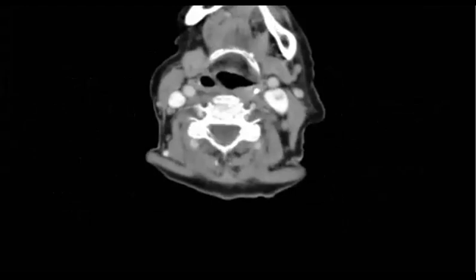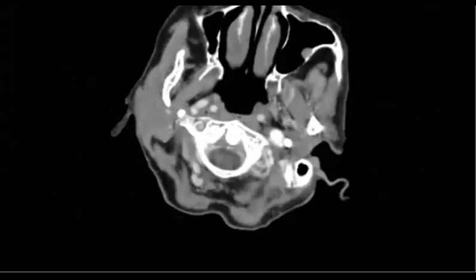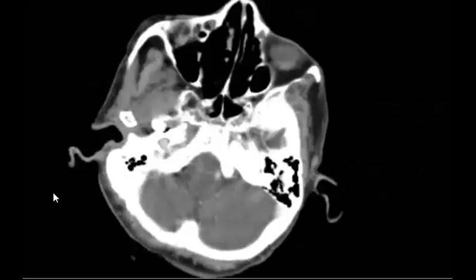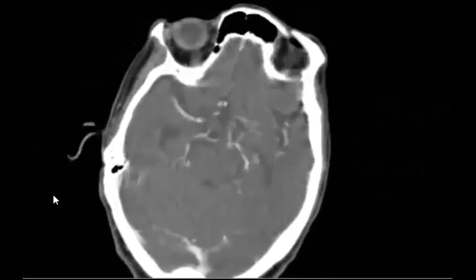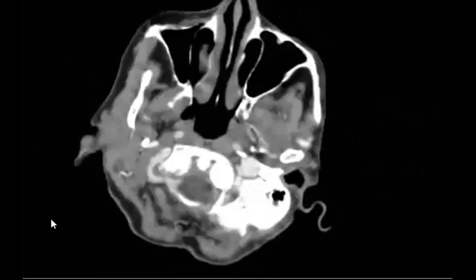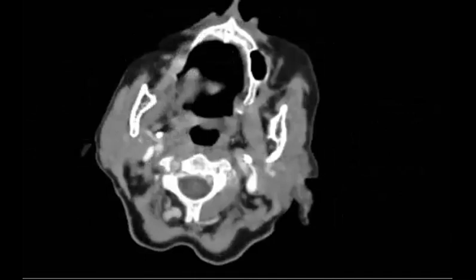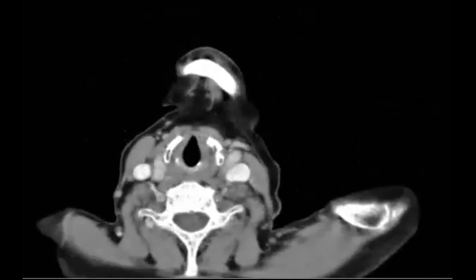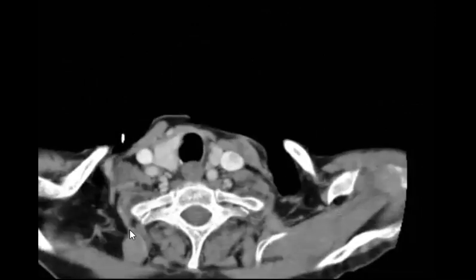Okay, now I will show you the neck. This patient, they found something and they want to know, is it something suspicious or not? So what do you think? What is this something, and what do you think about it, is it suspicious or not? So who will be our star tonight? And he will take the 100, maybe 100 flowers.